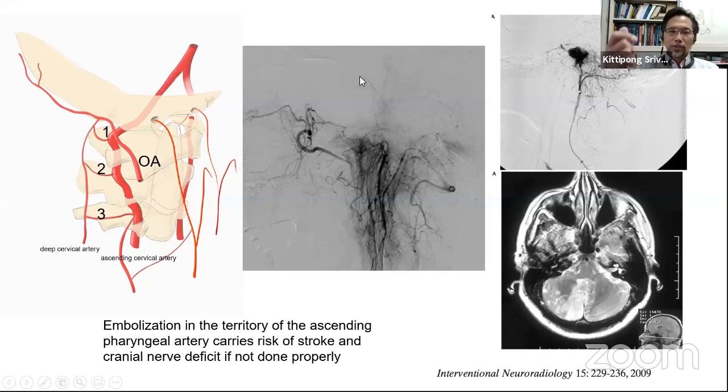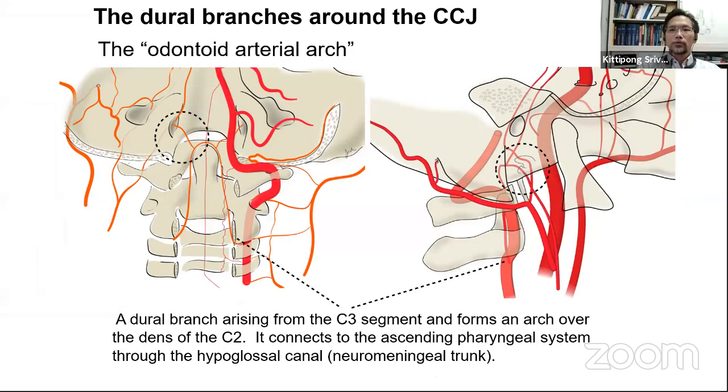Anything that suddenly stops will tell you it enters another system. So where is this? This is at the posterior clinoid process. So this is actually the point that it joins the internal carotid artery system at the meningohypophyseal artery origin. So this is very dangerous. You inject anything, you can enter everywhere. Okay, I will skip this.